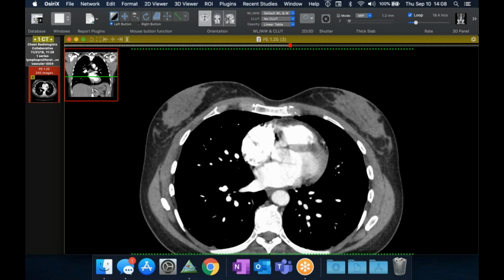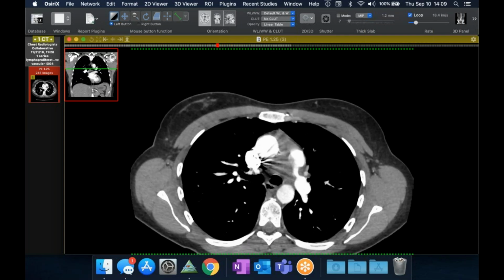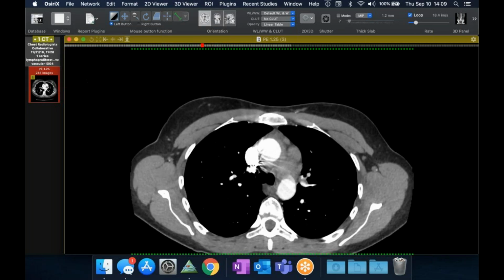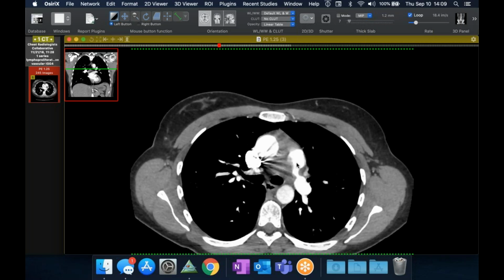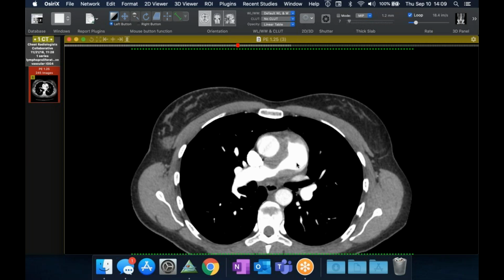That's interesting. I've seen it involving the aorta like that. I don't think I've seen one so focally doing that to the PA. I did look around, and there are some case reports of it, so it has been described. And I showed a case a while ago of a mediastinal mass that was IgG4. It wasn't involving the vessels, but I wonder with time if it would have. This whole spectrum of diseases never ceases to amaze me, because every so often we see a new manifestation of it.